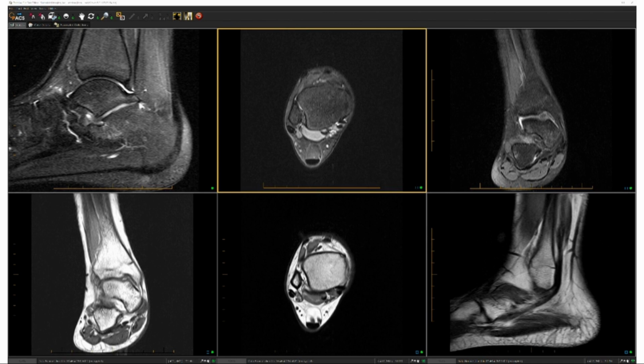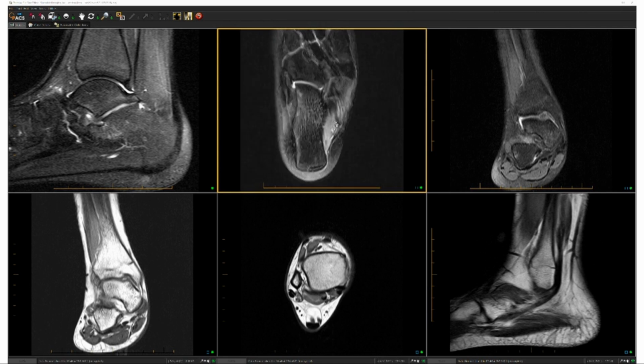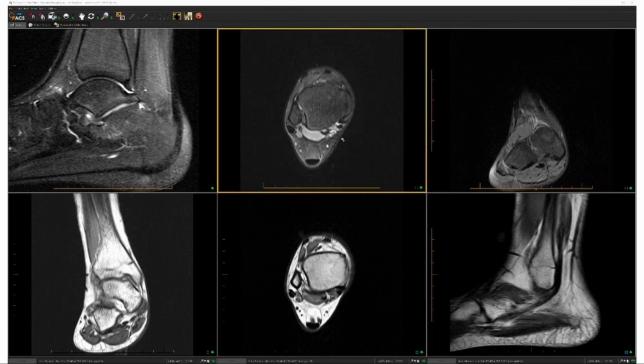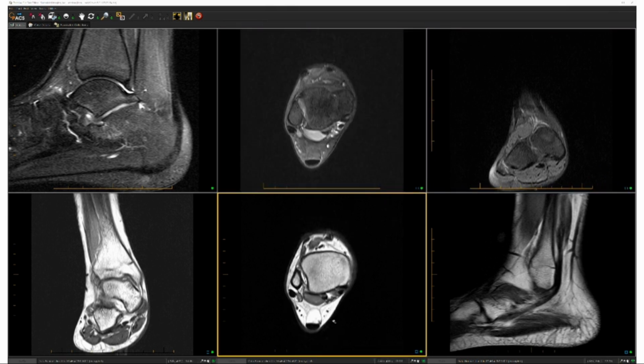It's more than 1.5 times the size of the flexor digitorum. So then looking at the flexor digitorum and flexor hallucis, those are normal. I go to the master knot of Henry just to make sure that there's no tenosynovitis, and we're finished with that area. Then I want to take a look at the tarsal tunnel.